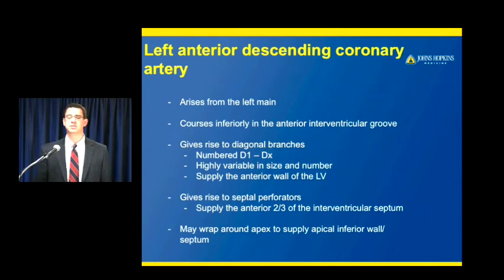The LAD also gives rise to septal perforators. These dive downward into the septum and supply the anterior 2/3 of the interventricular septum. Generally, we don't find coronary artery disease in these septal perforators, and they're not something we pay a lot of attention to. They're also pretty hard to see because they're very small. So these usually aren't a focus when we're doing our cardiac CT examinations.